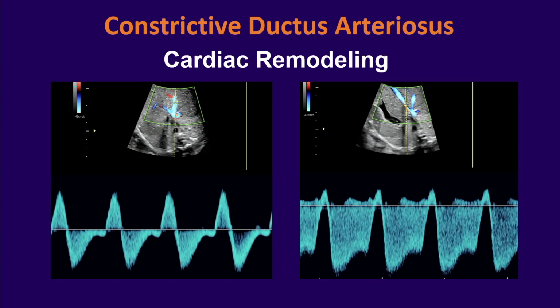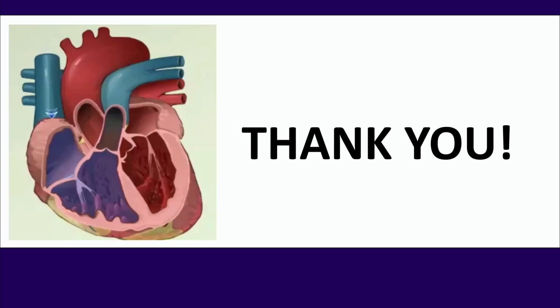So all those pathologies have some similarities, and I hope that, looking at the four-chamber view, you will utilize the checklist, so that you will not miss them in the screening setting, and make the exact diagnosis when you perform the fetal echocardiogram.